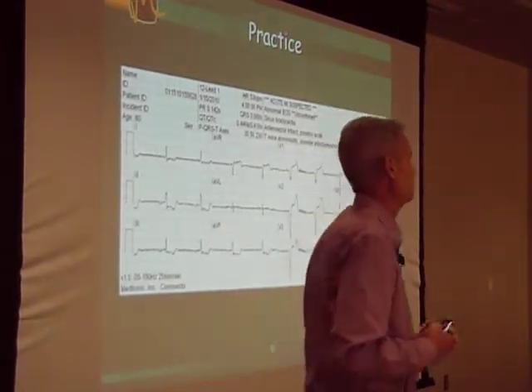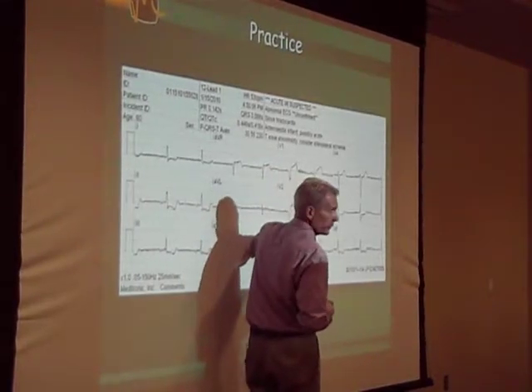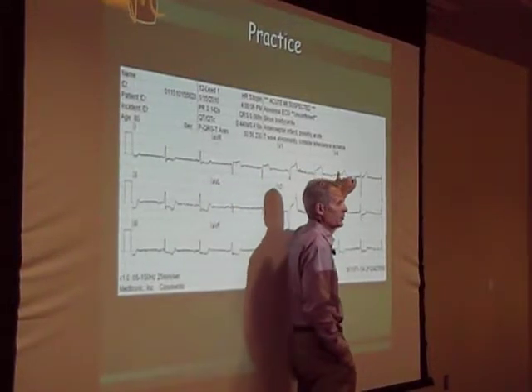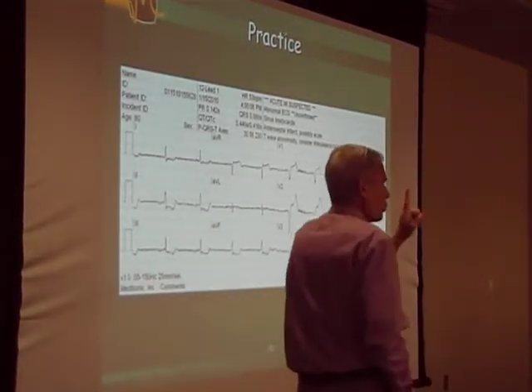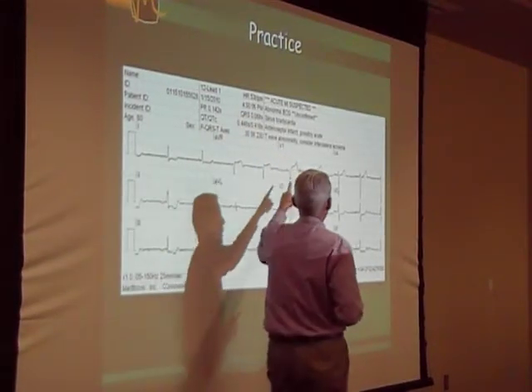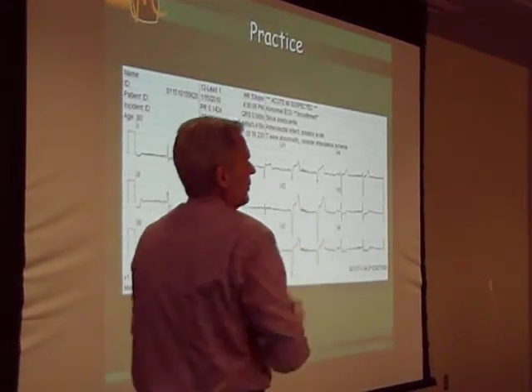So even though you don't have it continuous with V3 and V4, you still call it septal? Yes. Even though V1 and V2 are the septal leads, this is one standalone. Think about it: V1, V2, and V3 all sit next to each other. Now, as I do serial EKGs, is it possible I may start to see this transition into V4? Yes. That's why it's important to do ongoing tracings with your patient, not just one, because it may change along the way. So as long as you have it next to it, because they're contiguous. Correct. Now, if I had elevation in V1 and normal in the next ones, those aren't anatomically contiguous because they're not in the same area. But if they're grouped together, yes.